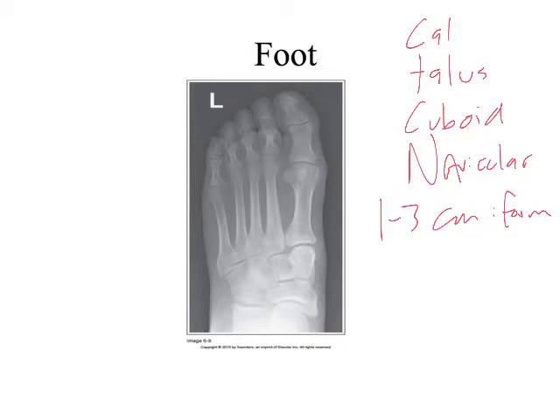So this is a difficult image to get and to have it appropriately exposed across the length of the anatomy represented, right? Because typically we're dealing with a fairly low technique, and we have a piece of anatomy that looks like this, kind of, right? So we would expect to see things a little bit more bright here and more dark on this end, right? Just because of the way the anatomy is working and the way the remnant beam is, okay?